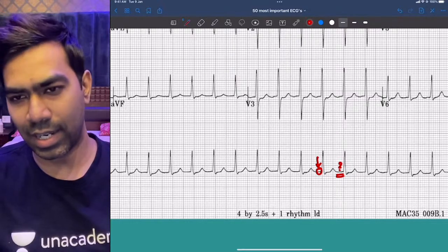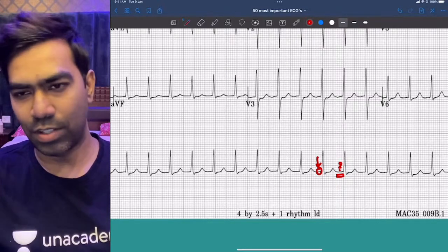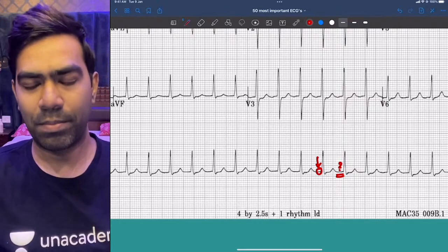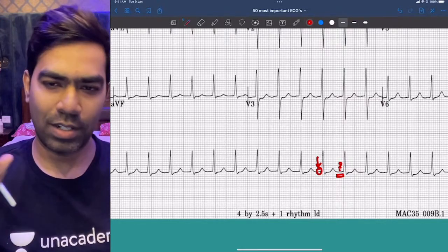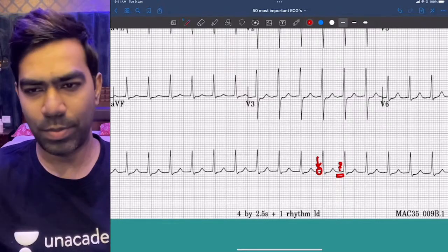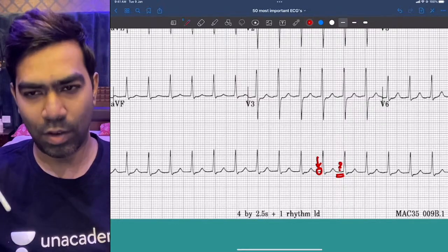Even though supraventricular tachycardia is a term that is used for any tachycardia apart from ventricular tachycardia, usually AVNRT is the one that's synonymously called PSVT or supraventricular tachycardia. But that should be avoided, at least in modern practice. But how do you diagnose AVNRT?